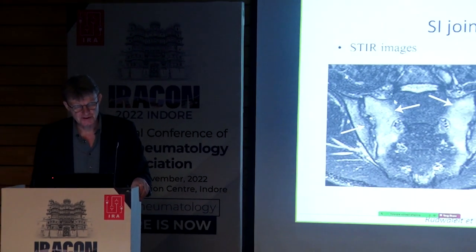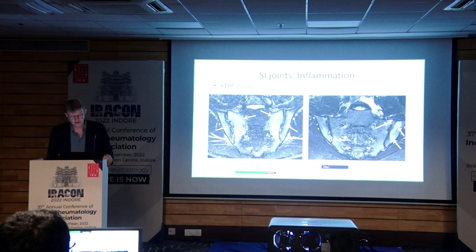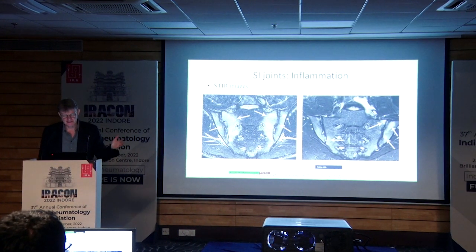Look at this down here and say, okay, this is inflamed compared with this, then you'll be fooled, because sometimes the signal is inhomogeneous, so varying due to inhomogeneities in the coil or in the magnet that you're doing, so compare horizontally. How is it here compared to here, and there's no difference. This is inflammation, this is bone marrow edema, this is other examples of it here. This is better images illustrating the same thing, bone marrow edema around the sacral joint. And again, you see how nice images can be when you have it in the semicoronal plane. You can see three different intervertebral phenomena here, and it's easy to get an overview.